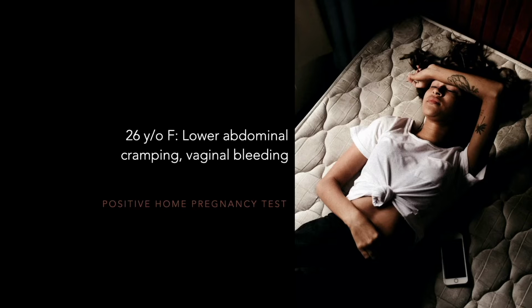While I can't attach a name and face to this, there are HIPAA issues. These are very much inspired by patients that I've seen over the course of my practice, right? So patient number one, imagine you're presented with a patient who's a 26-year-old female who says, I've been having some lower abdominal cramping. And today, I noticed there's some vaginal bleeding, right? I was wondering what was happening, why the cramping was happening, and all of a sudden I started spotting and it's starting to pick up a little bit.